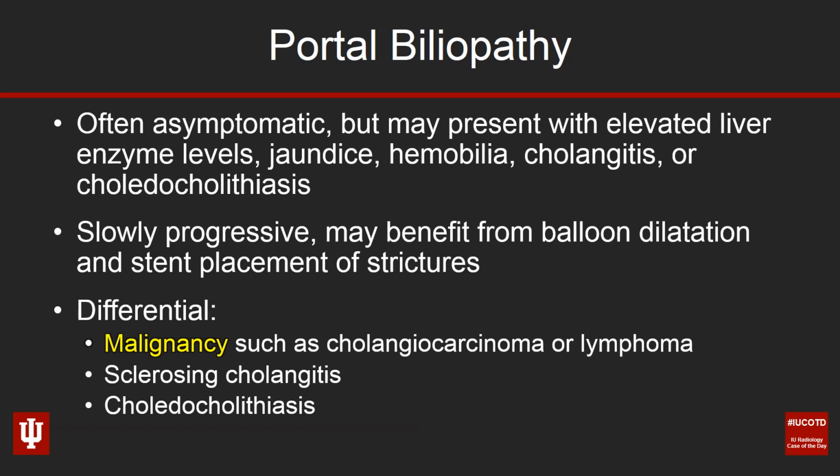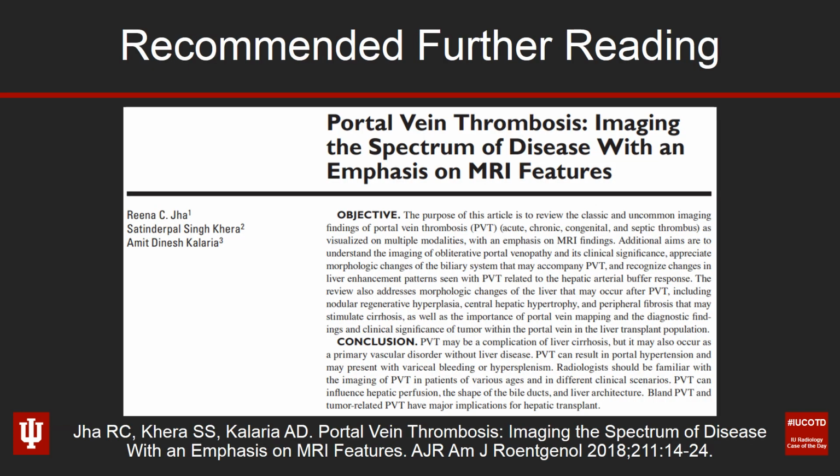Choledocholithiasis can also cause biliary ductal dilatation and can occur concomitantly with portal biliopathy, so again, careful scrutiny is in order. For more reading about portal vein thrombosis and its spectrum of disease, I'd like to recommend this paper.